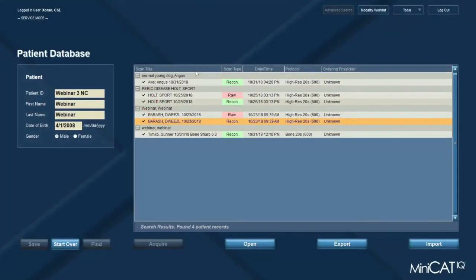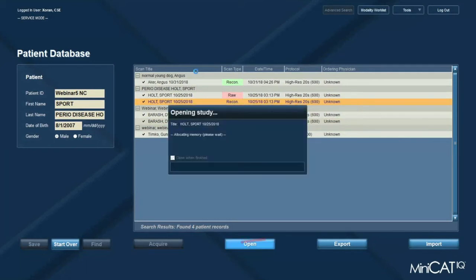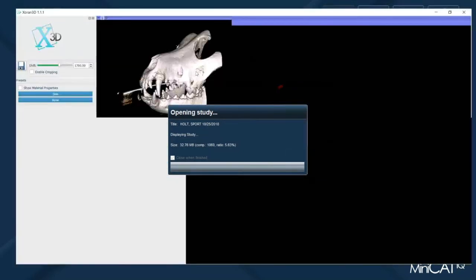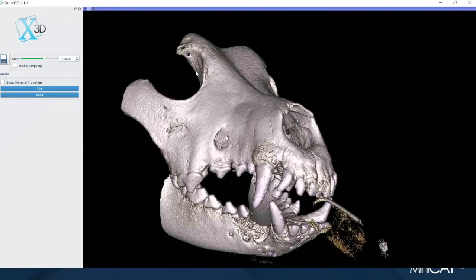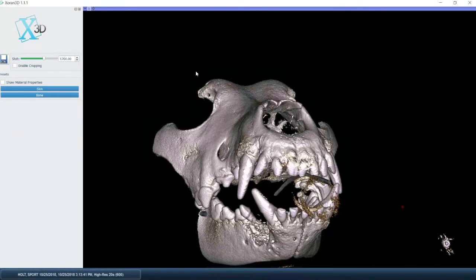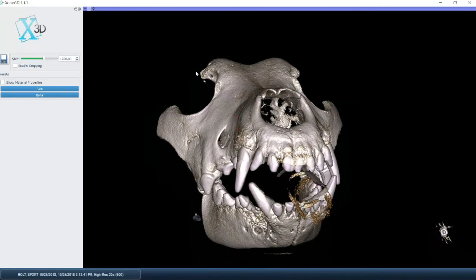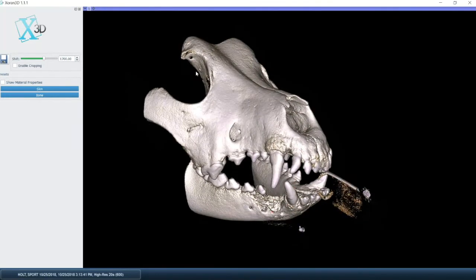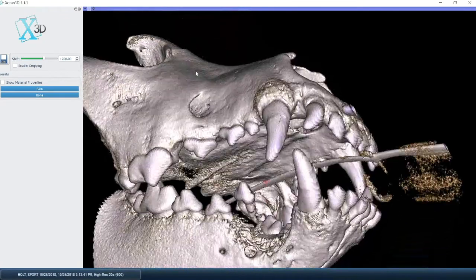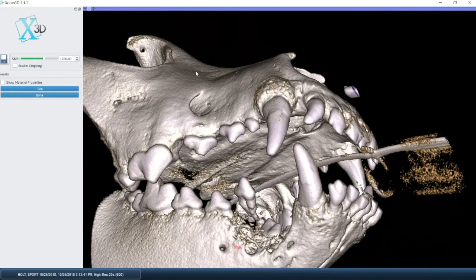And finally, let's now look at a more advanced patient situation. And if we bring up the 3D on this patient, what do we notice? We can also utilize the 3D for a quick view of significant bone loss in general. Again, to be a little careful, of course, we notice at the mandibular right area, complete bone loss. One of these teeth, at least this one here, is only retained by soft tissue. There's really no bone to speak of in this very significant area.